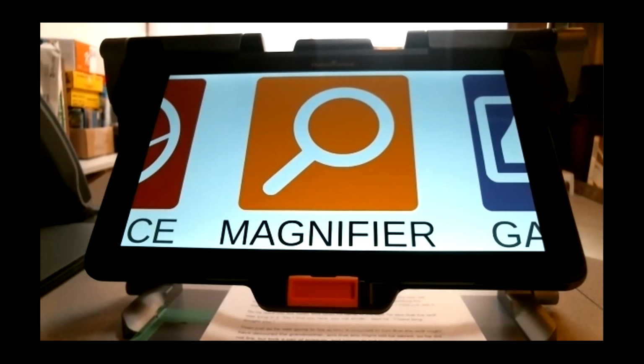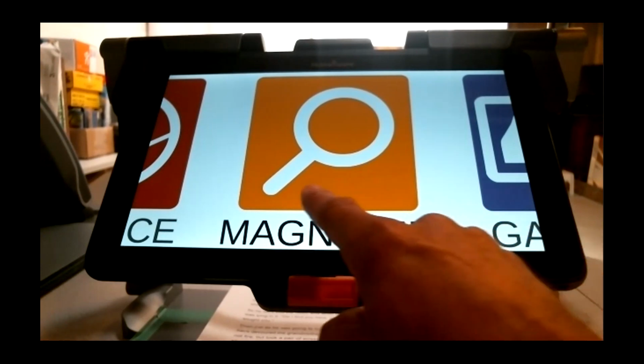All right. So we saw the Magnifier application, which is the main application when you're going to be using the Connect 12 or teaching the Connect 12. This is your main application. This is your go-to application. The Magnifier is the one. So we saw all the gestures that you can do, all the little tweaks that you can do also. And then the second most useful application I find is the Distance application.